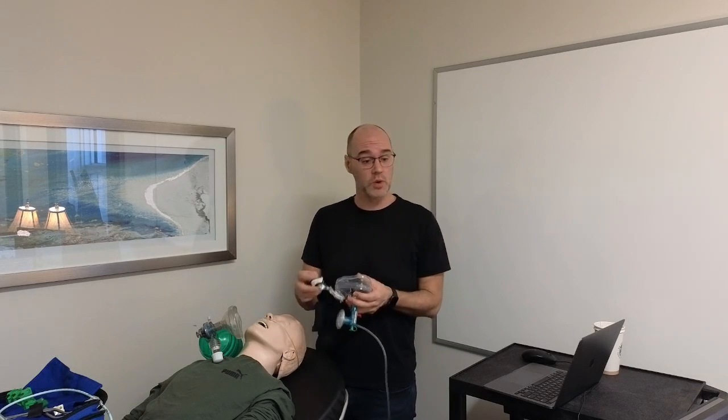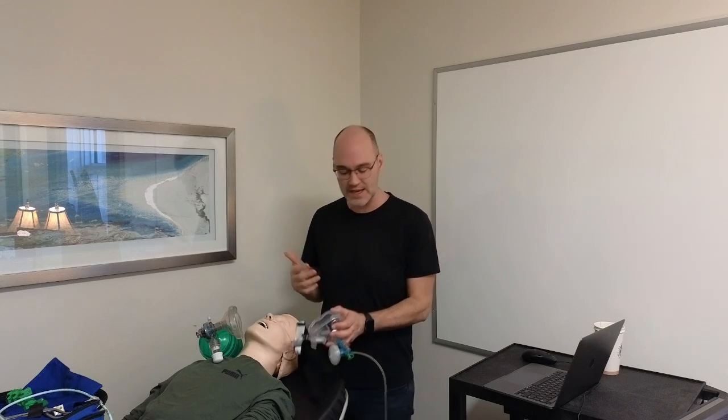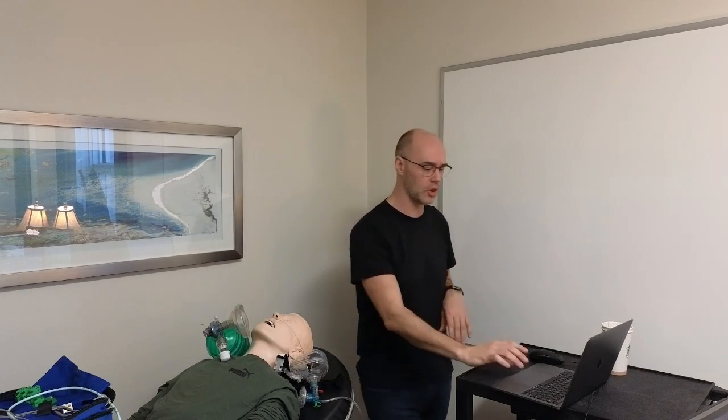Now, what is the effect that we want? We want increased oxygenation. We would like to see the patient get better with this treatment. If we're thinking of CPAP, we should see ease of respirations. I do find that this works after about 6 breaths. Patients start to see a benefit, so it doesn't take very long. So we apply this, and we see ease of respirations, increasing oxygenation, and CO2 leveling out into the range that we want. In a BiPAP patient, if we had really high levels of CO2, we'd like to see that come back down to normal, with improving mentation, improving level of consciousness, and SpO2. So that entire clinical picture is what we're looking to create.